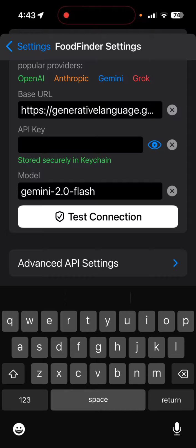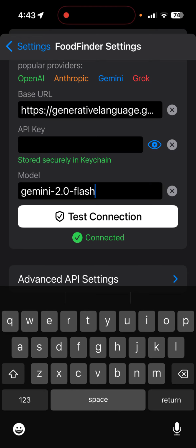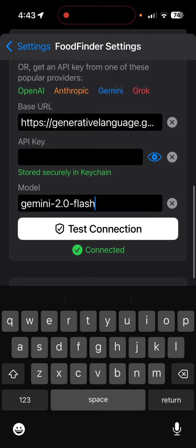But you should be able to maintain it over time and not have to complain that, oh, shoot, it doesn't now support the newest version of Gemini models. That was a big problem for people, and I hated that. So we fixed that. And you can test the connection ahead of time, and hopefully you get a positive result. But this is a cool feature, making it agnostic for you.